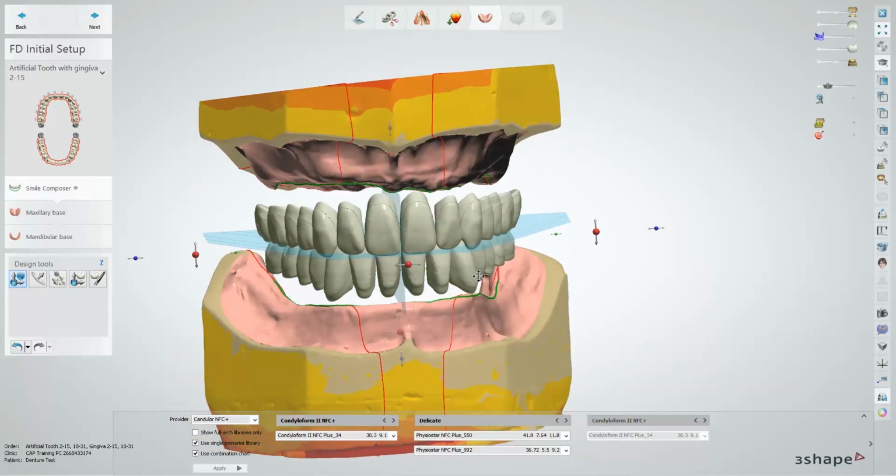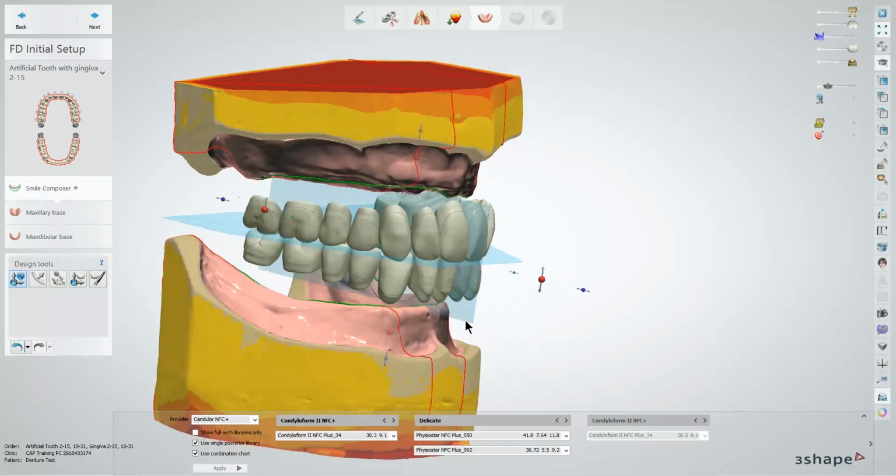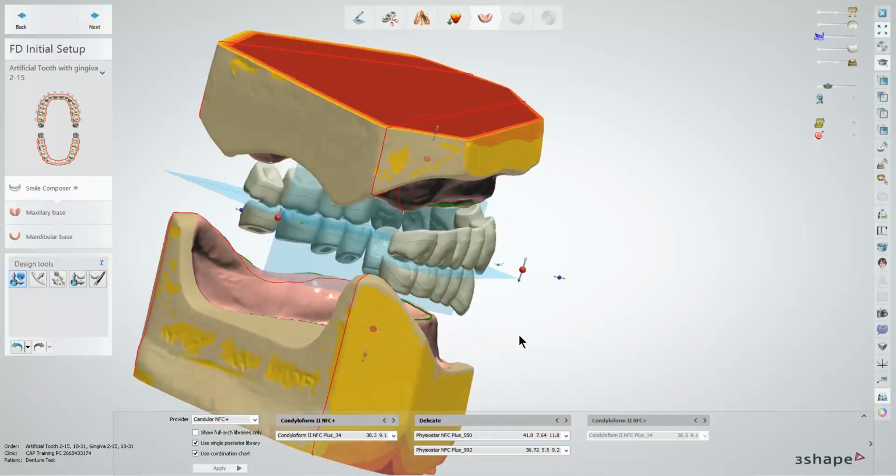There are some exceptions where certain combinations of anteriors and posteriors of certain sizes may not line up exactly correct due to the different sizes available, but for the most part, the default position should be in occlusion correctly.